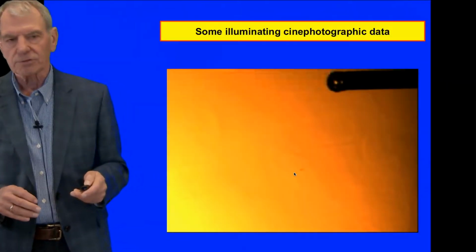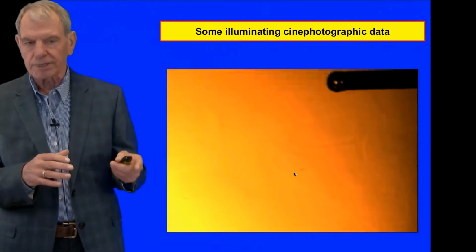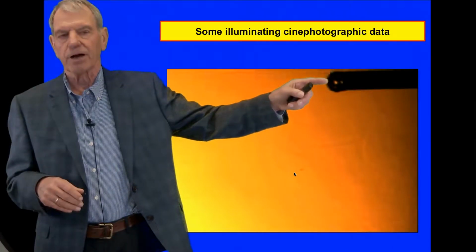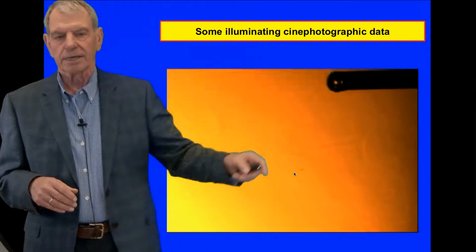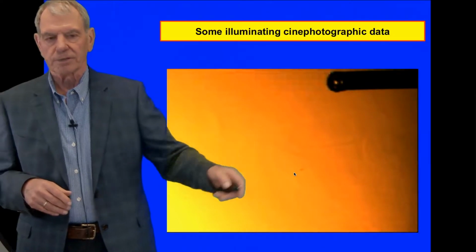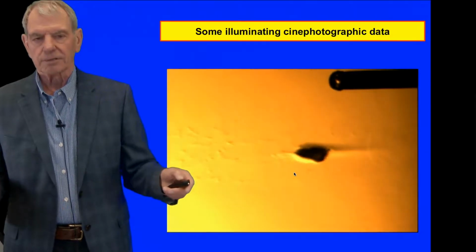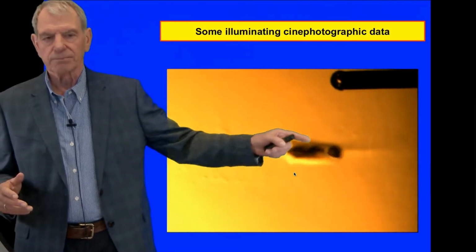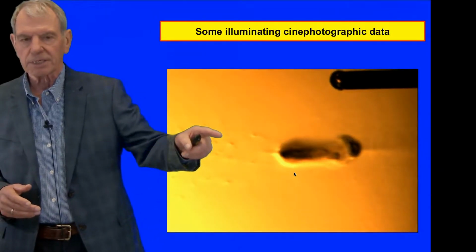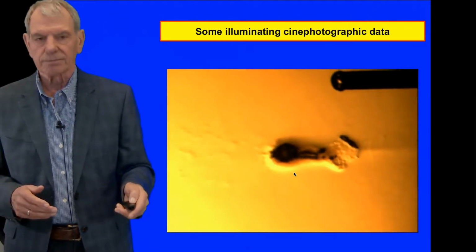This is now a close-up of cavitation and boiling occurring in a phantom tissue. This is a phone, a fiber optic hydrophone, and the cavitation is going to occur in this gel in this vicinity. And so here's the movie, and you can see in a few milliseconds you get this big bubble here. That is boiling, and it's hard maybe to see here, but this is cavitation. So let's look at it in a little better frame.